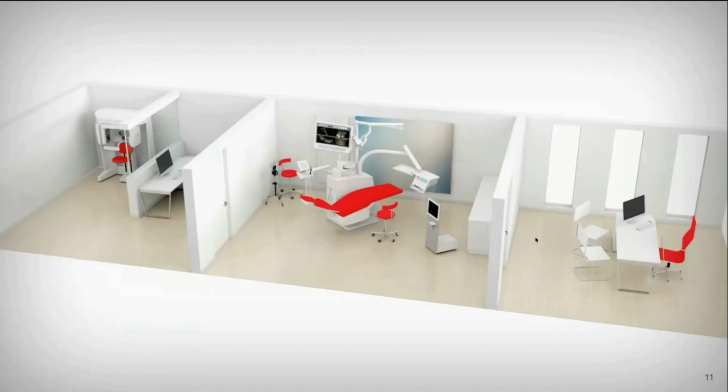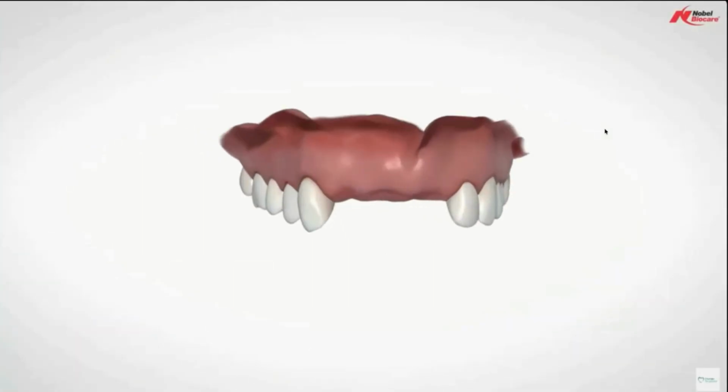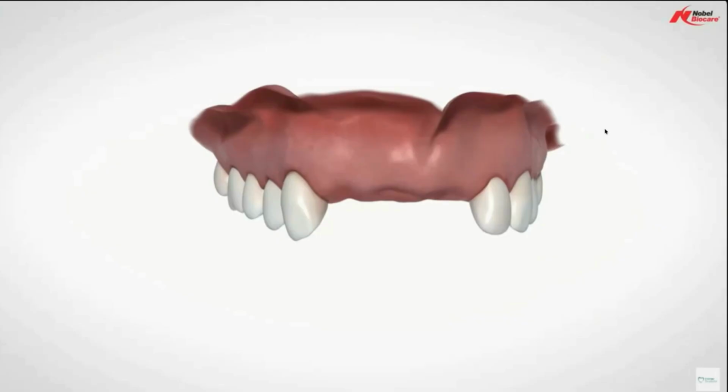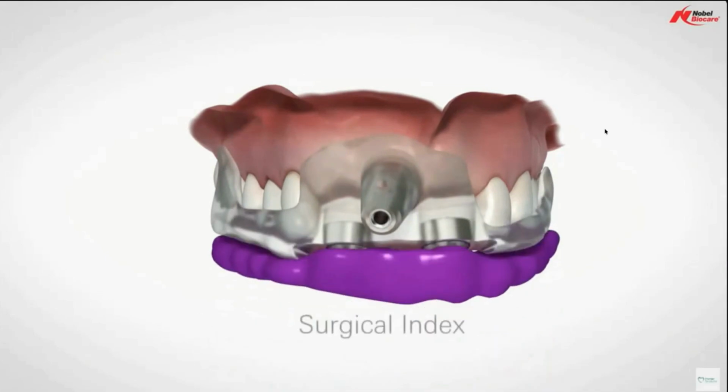So from a workflow perspective, as I mentioned, we start out with the cone beam CT. We get some intraoral scans from either in the office or share the models with us, and then everything gets merged on the computer as we go forward. So I just want to share with you an animation. This will walk you through, and I will fast forward some parts, but this will walk you through the different approaches you can do from a surgical perspective. So, we've done our pre-planning. We know where we want to end up. We may even do some contouring of the soft tissue on the model for the case.